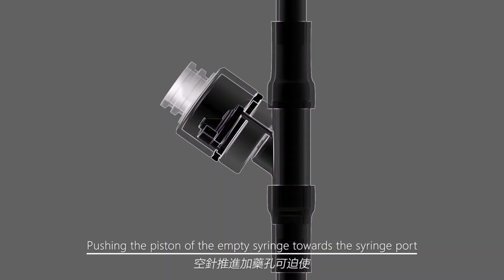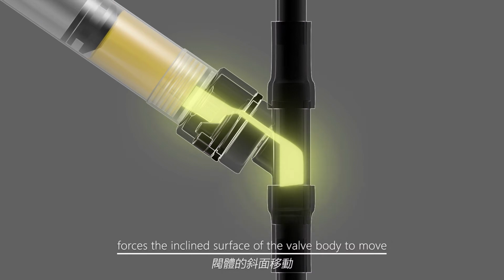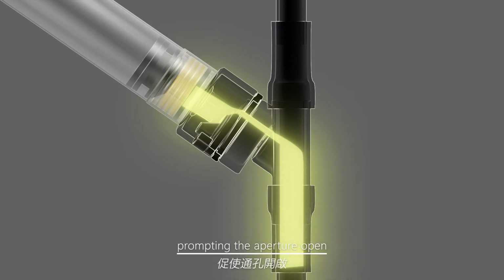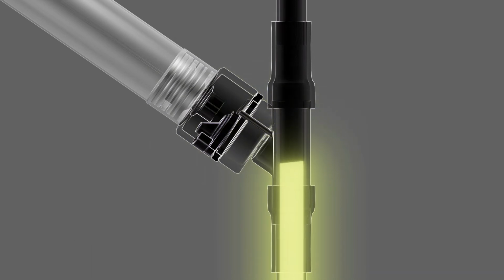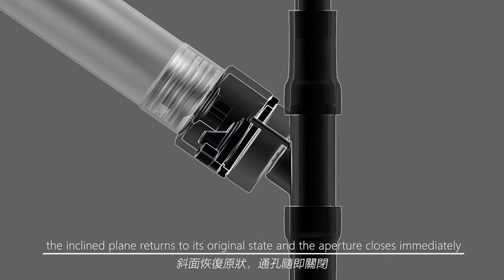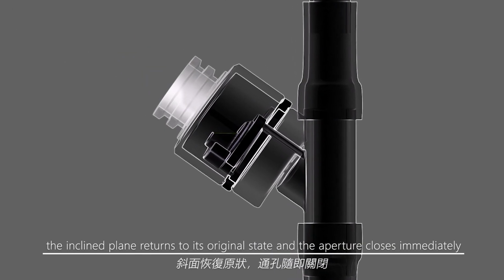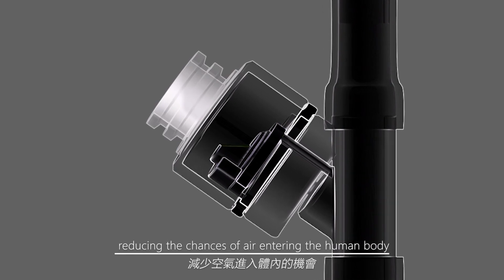Pushing the piston of the empty syringe towards the syringe port forces the inclined surface of the valve body to move, prompting the aperture to open, which enables the drug solution to enter the human body through this route. When the empty syringe is pulled out after the administration, the incline plane returns to its original state and the aperture closes immediately, reducing the chances of air entering the human body.